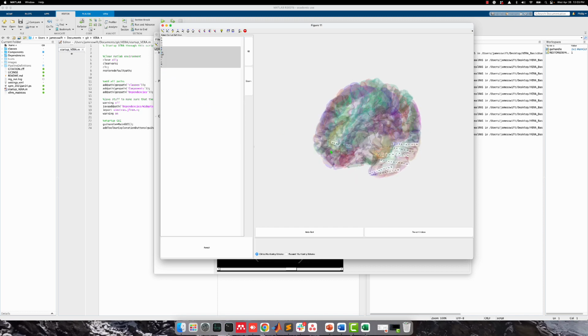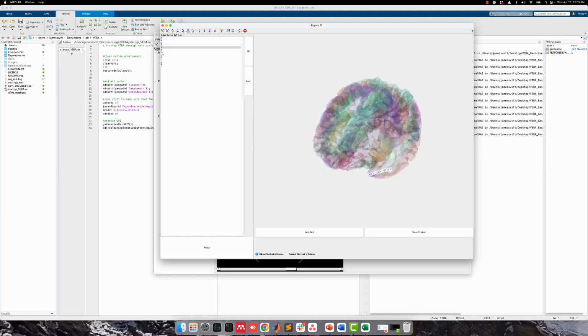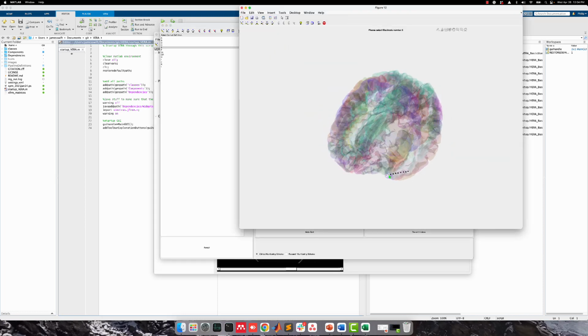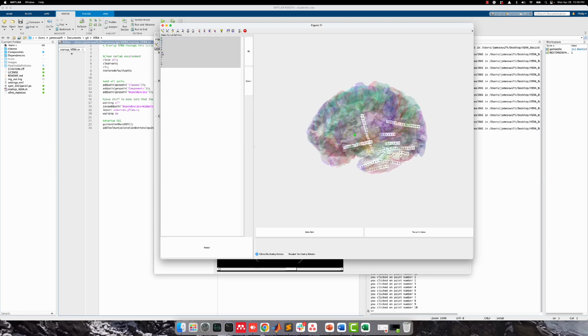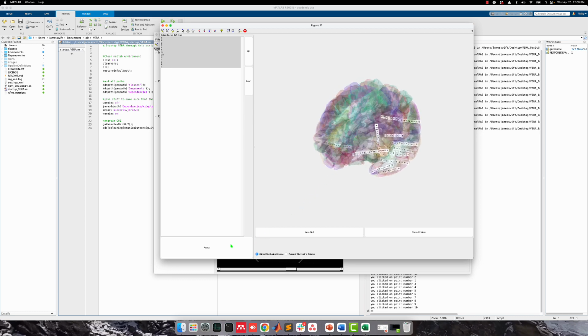Again, double-check the numbering of each implant to ensure that it is correct. When you are finished, hit Accept.